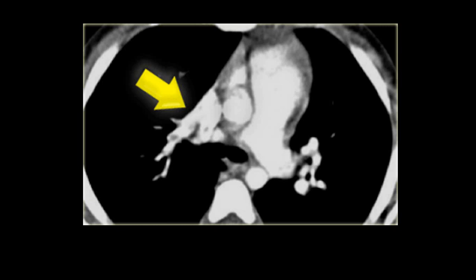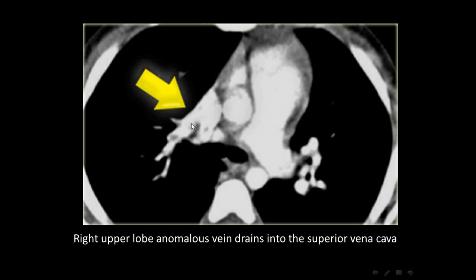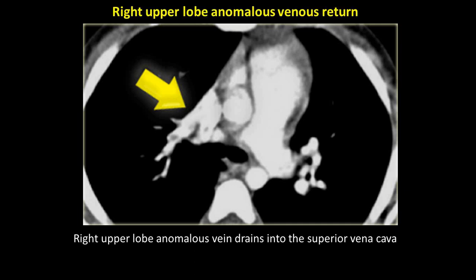So in this case, this is the superior vena cava, and this is the right upper lobe vein draining into the superior vena cava rather than draining into the left atrium, which is the normal course of the pulmonary veins. So this is a case of right upper lobe anomalous venous return.